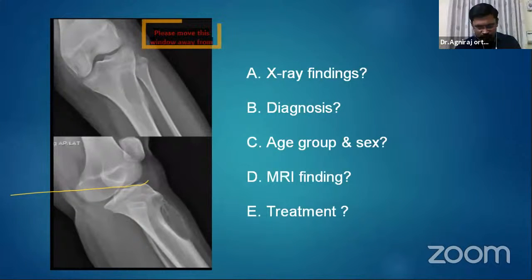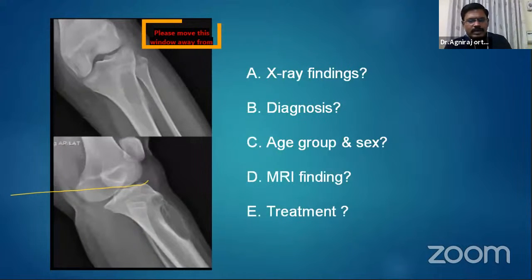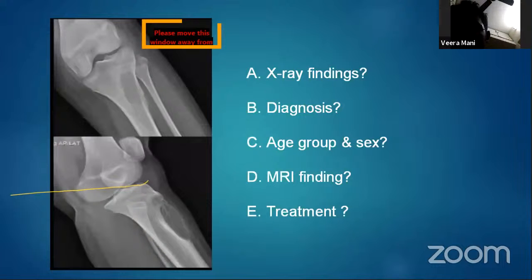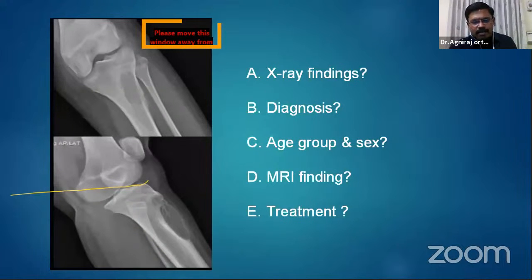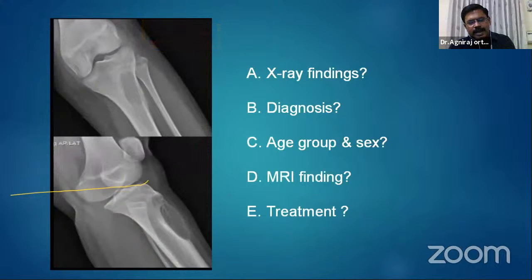Okay. So next one is periosteal reaction. Is there any periosteal reaction seen or not? Yes, sir. Periosteal reaction is there. In which view are you seeing the periosteal reaction? Sir, in lateral view I see it more clearly. Okay. Whether it is centrally or eccentrically located, you didn't mention. Sorry, it's eccentrically located. An eccentrically located, expansile, lytic lesion in the metaphysis of the upper tibia, geographic type of bone destruction with well-defined border, with some periosteal reaction seen in the posterior aspect of the lesion. And matrix, what do you want to say about the matrix? Sir, osteoid matrix, sir.